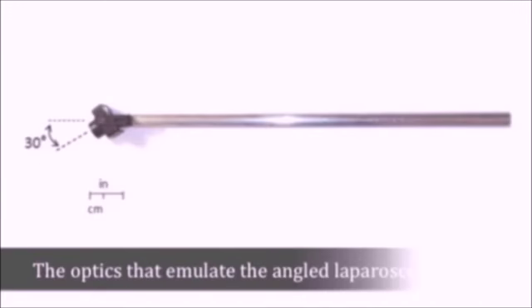The ability to handle and adapt to the visual perspectives generated by angled laparoscopes is crucial for skilled laparoscopic surgery. However, the control of the visual workspace depends on the ability of the camera operator, who may not be the most experienced member of the surgical team. Here we present a simple, low-cost option for surgical training that challenges the learner with static and dynamic visual perspectives at 30 degrees using a system that emulates the angled laparoscope.